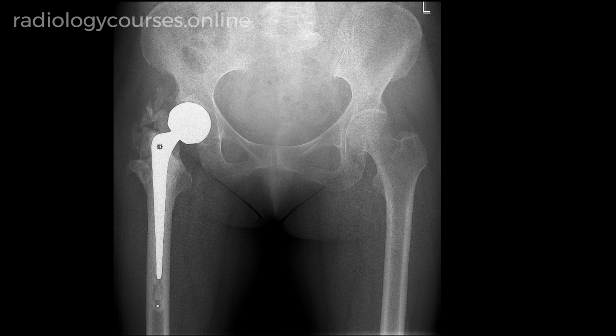Mild is very few areas of heterotopic bone formation. Grade 2 is a few or multiple areas of heterotopic bone formation with a gap of more than 1 centimeter between the greater trochanter, heterotopic ossification and the acetabulum, and grade 3 is a less than 1 centimeter gap between the acetabulum and heterotopic bone formation, and grade 4 or ankylosis is where the heterotopic ossification is fused with the acetabulum.